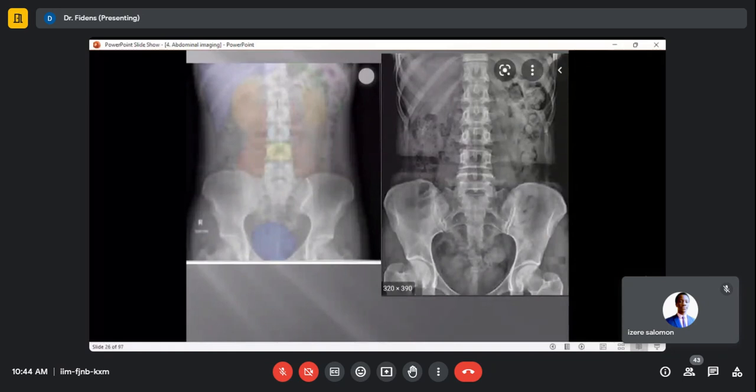That's a good question. Maybe I confused you, but listen, for plain abdominal X-ray, when you have it in front of you, check identification first, okay? And immediately you go for ABCS.